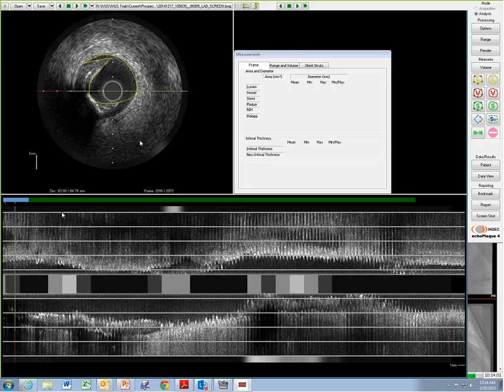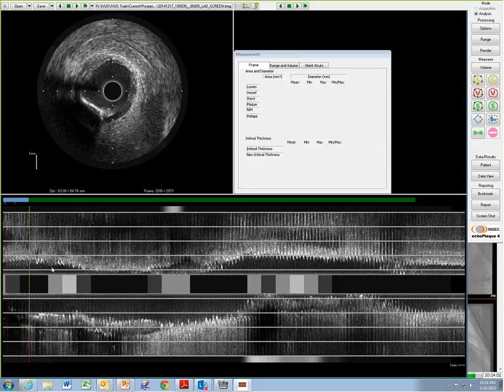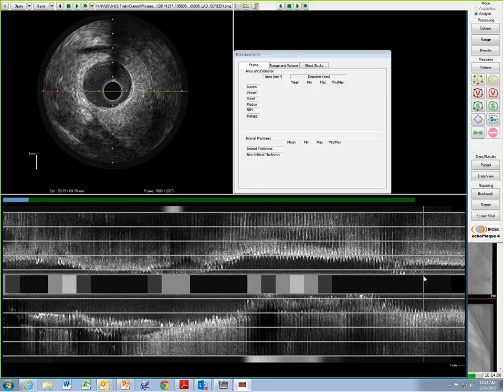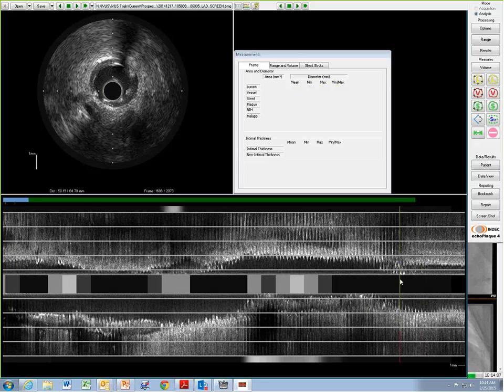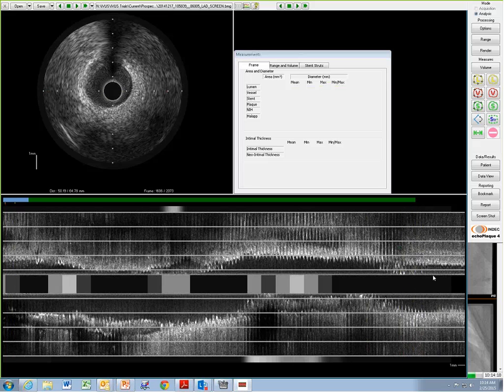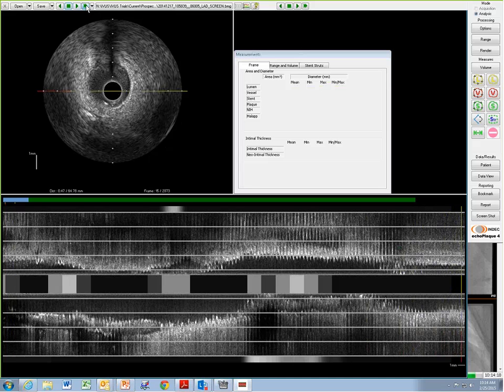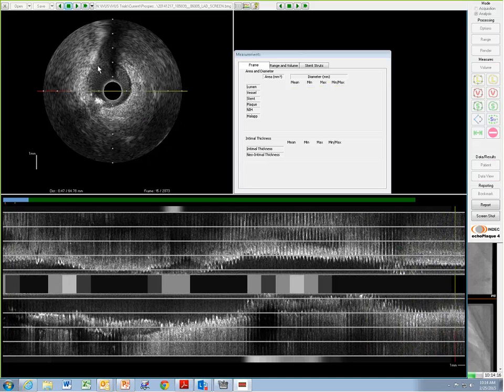Yeah, I totally agree. Then in this case, I see one more thing. So go to the distal now. I'm talking now that this is the standard of the distal, and I go to the distal. So let's start from here, and what you see. Okay, keep your mind somewhere here.